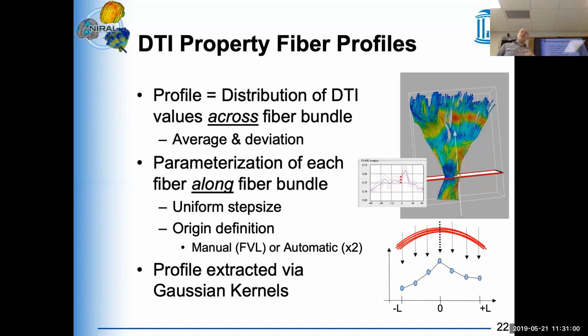Our methods determine this plane of origin automatically, so you rarely will have to change that. There are cases where the automatic procedures will fail, and I can draw that here. I'm sorry, that's not going to be on the video. But if you would have, let's say, a fiber tract that looks like this, we would have a plane that goes like that.